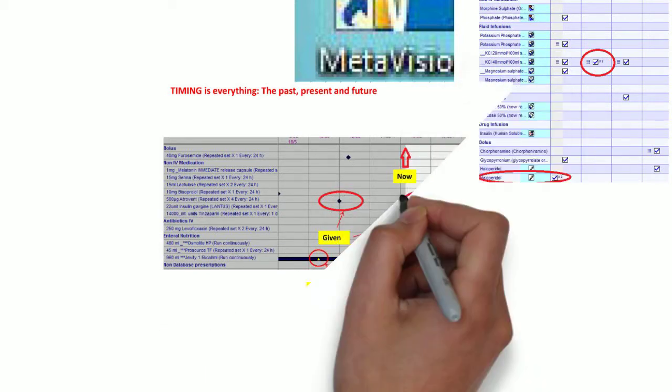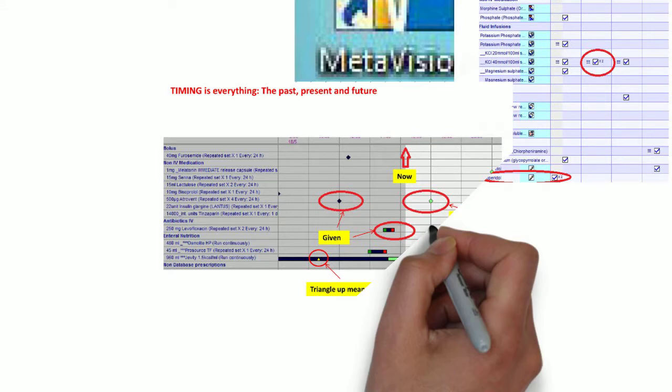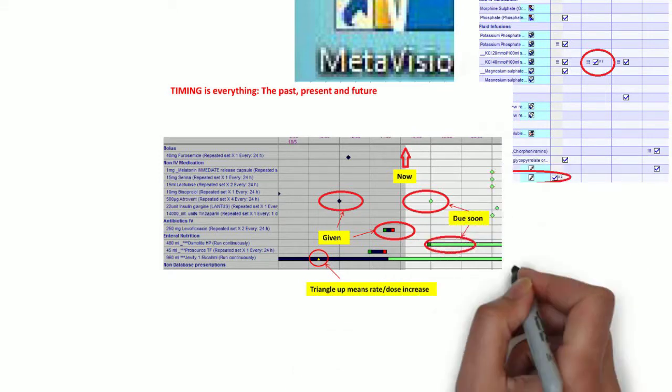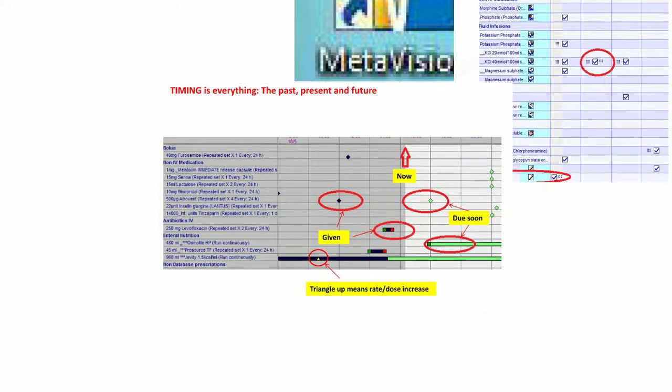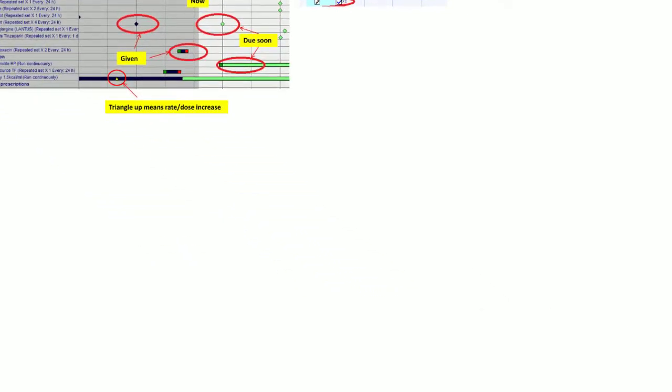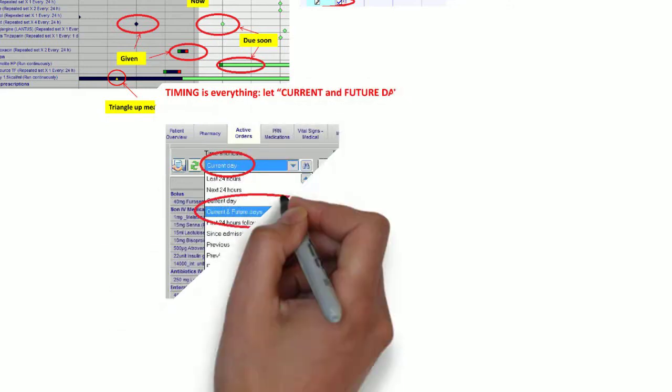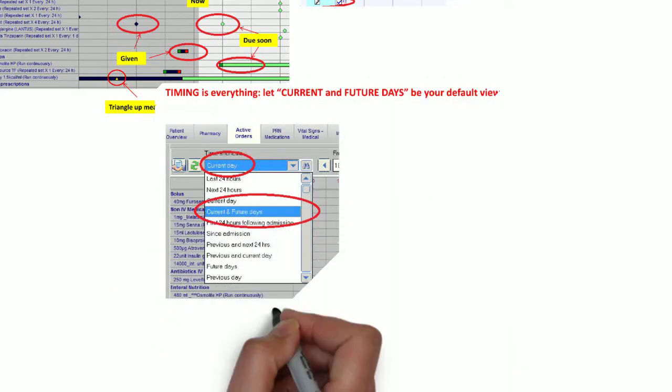In the grey section of this view, you can see drugs given in the past, and in the white, you can see those to be given in the future. We follow an example of anticoagulation, a common requirement on any ward.